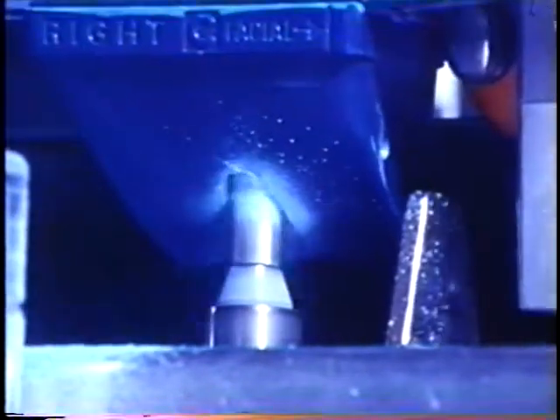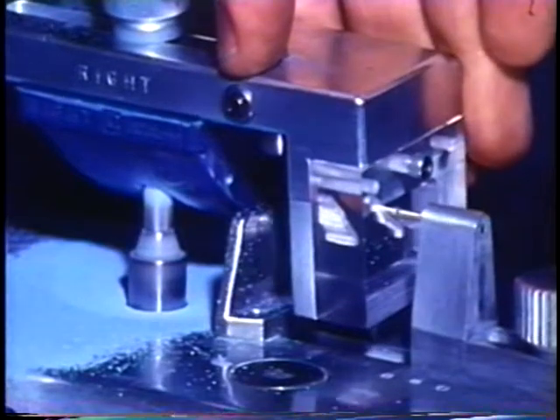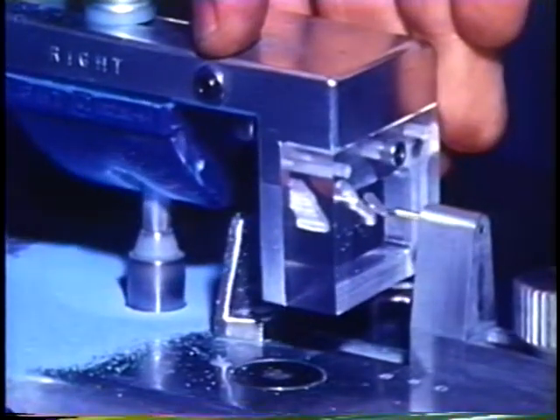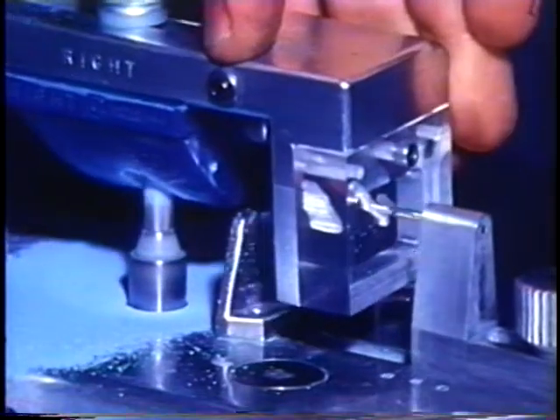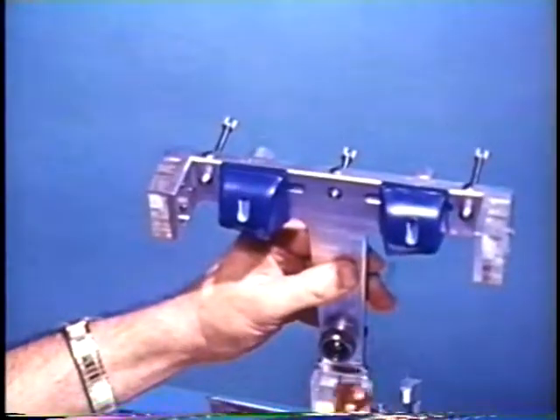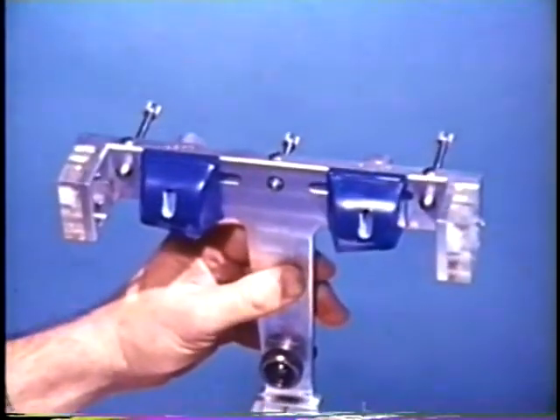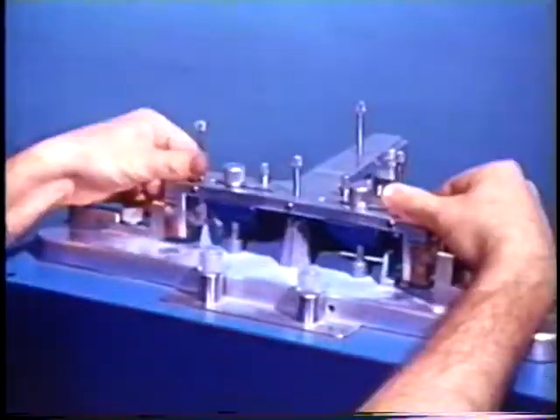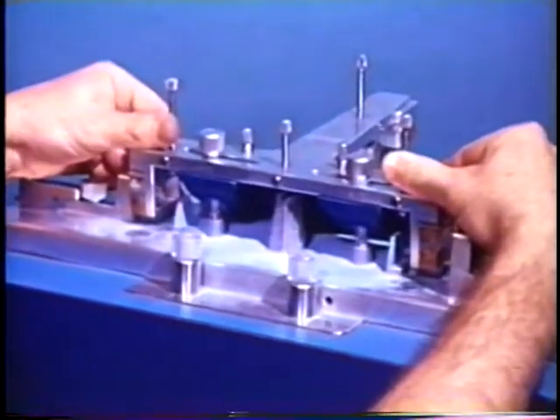The first step was to mill the straight protrusive movement. Here you can see how the milling followed the patient's protrusive recording. After the protrusive movement was engraved in one side of the clear plastic blocks, they were then swapped left for right to use their blank side for recording the lateral movement.